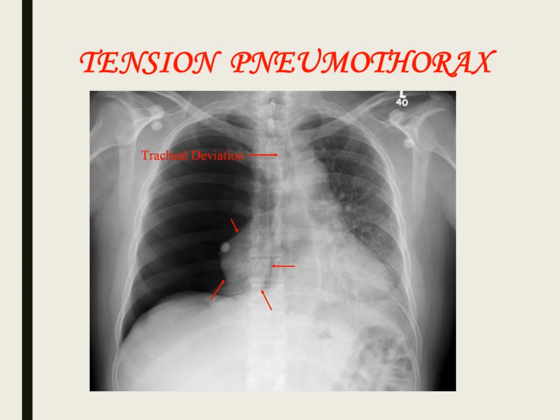B, bones. Let's say they look fine. C, heart. Well, the heart looks maybe a little biggish, whatever. D, diaphragms. You can see this one as well, probably with the lung being pulled over, but definitely you're seeing the left diaphragm, right? E, everything else. Anything abnormal? Is that the colon under the diaphragm? Well, there's probably some air.